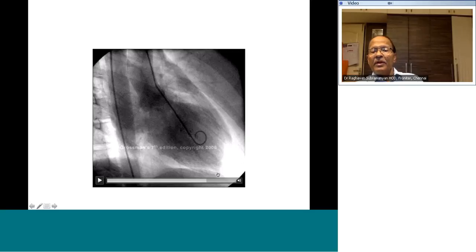The apex pointing down and left, sitting on the diaphragm. Therefore, it will be a very good view for seeing the ascending aorta, left ventricle, mitral valve, and the LA. You also see the descending aorta behind the heart, the posterior medial. So, right anterior oblique view: spine towards the left side of the image, and an ellipsoid image with apex pointing down and leftward is right anterior oblique view.